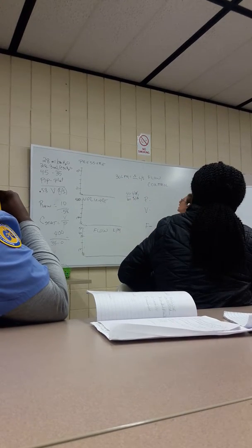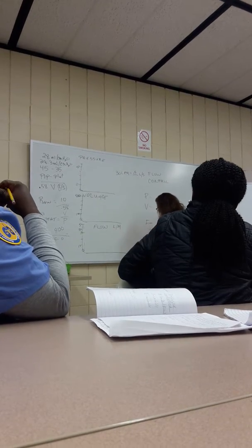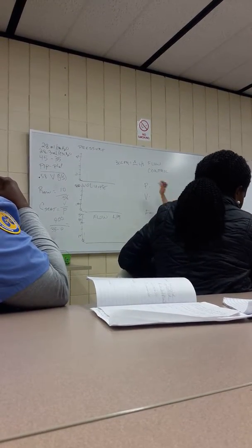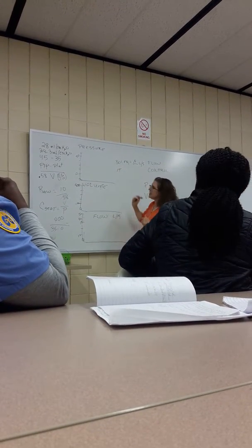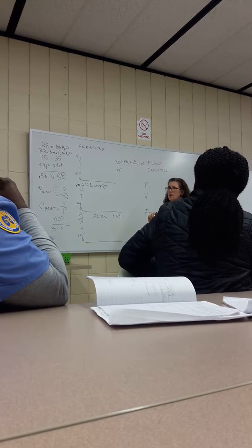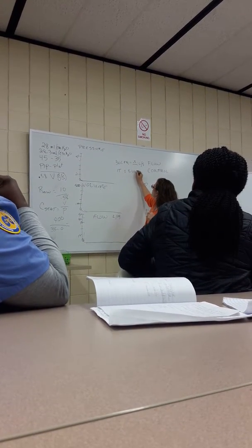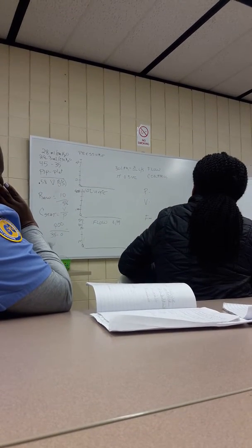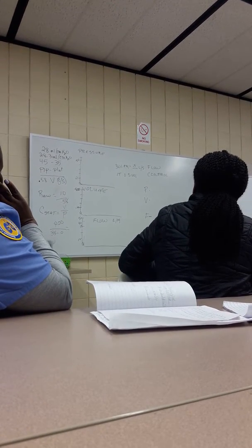So if I deliver that breath and set my inspiratory time to 0.5 seconds, how many liters am I gonna get?